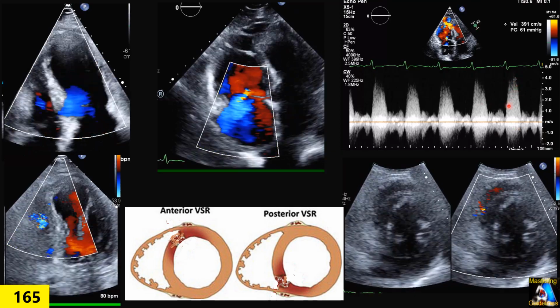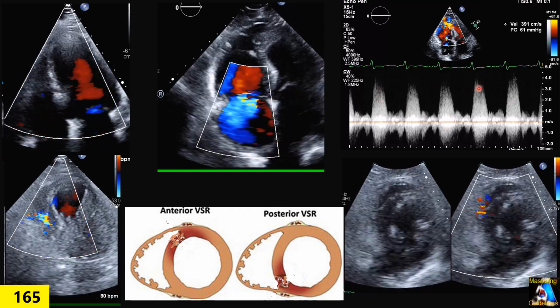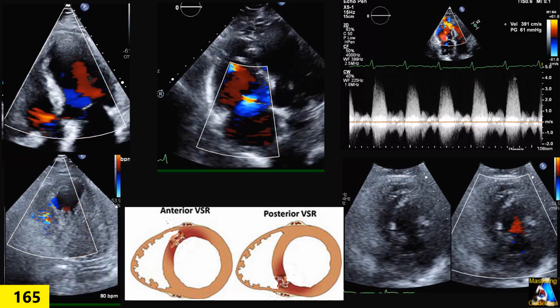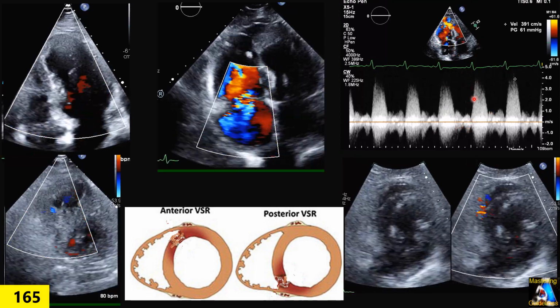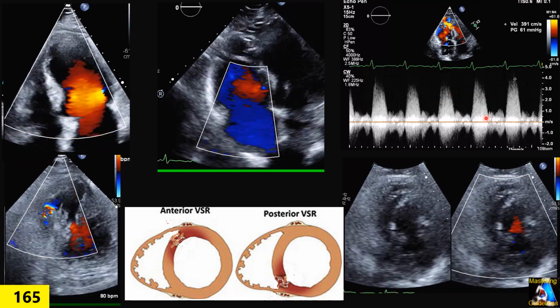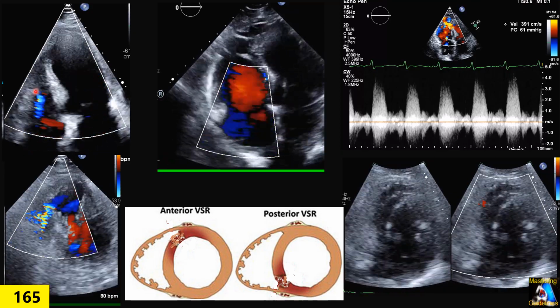One of the tips is that one. The second, it should be a shunt. So you have to follow and find where is the source of the shunt and the Doppler you see on your study. So, one more time, any abnormal jet, you have to think about a shunt.